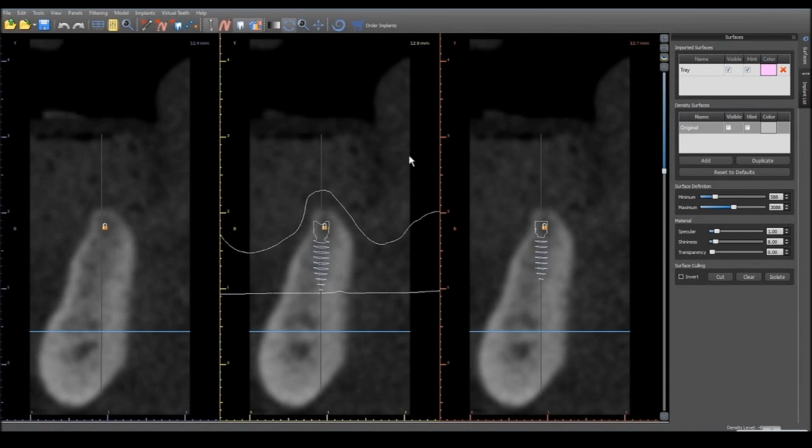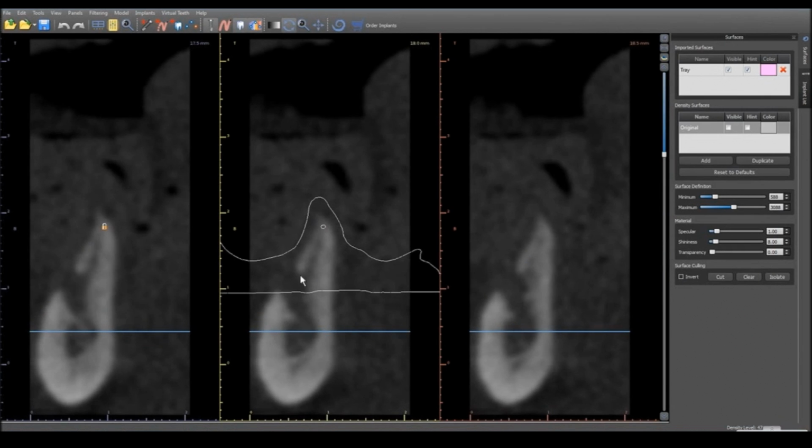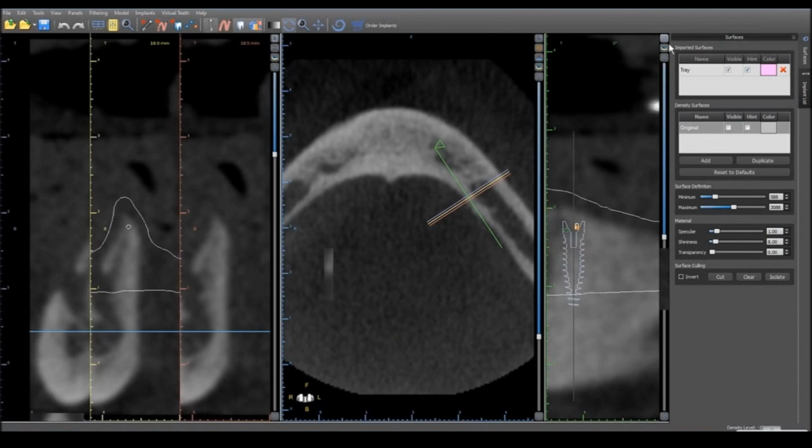And then we had another bone screw horizontally behind this implant. And again, you could see why the bone screws have to be planned, because he did not have much ridge and the mental foramen is there. So if you just placed screws anywhere, you would have a chance of getting in trouble.